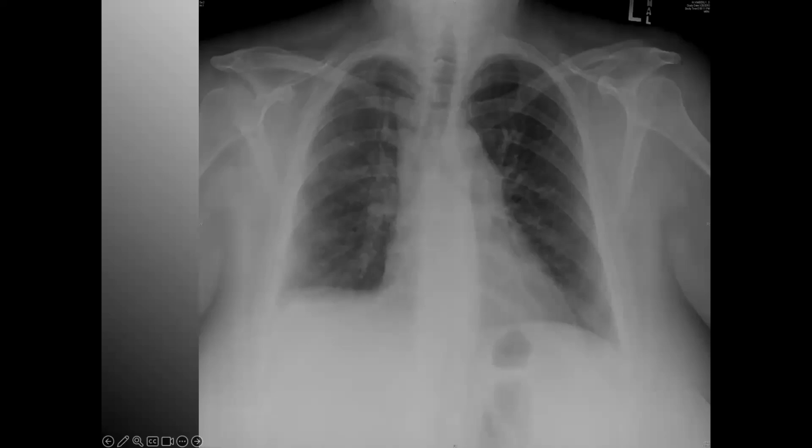We have volume loss. Recall that if you have a significant amount of fluid in the pleural space, you're going to have adjacent lung compression. Are you going to have atelectasis? Sure. Now, are you able to differentiate between atelectasis and effusion? It's not always simple to do that. And much of the time in a radiology report, you will see they'll say, atelectasis versus effusion or cannot clearly delineate. Some are more confident than others, but I would argue unless you know Hounsfield units and you're actually scanning the different densities with the naked eye, it's almost impossible to tell the difference between a significant lung collapse and an effusion. Here's the only way you can tell the difference.